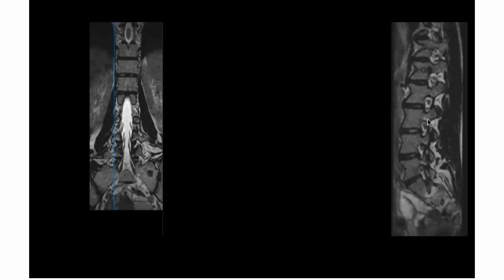Some space between the pedicle and the nerve root, which means it is a free nerve root over here. Now suppose there's a herniation over here. If you still see the root over here with surrounding space, it tells us that although the herniation is there, into the foramen, it is not sufficient to compress the nerve root. Nerve root is free.